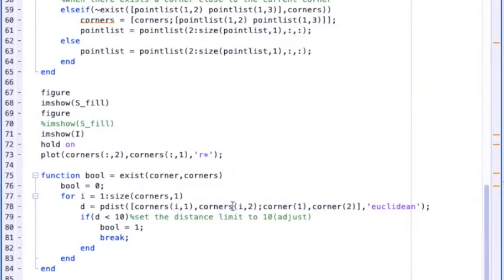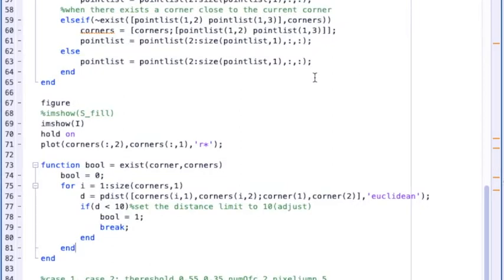There are still some limitations. The first one is about the edge extraction. This algorithm depends heavily on the edge extraction. Although we use Canny edge detection, one of the best edge detection algorithms, it is still hard to get clear edges from X-ray images, and that will have a negative influence on the detection result.